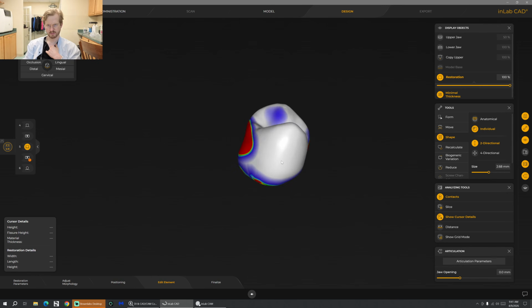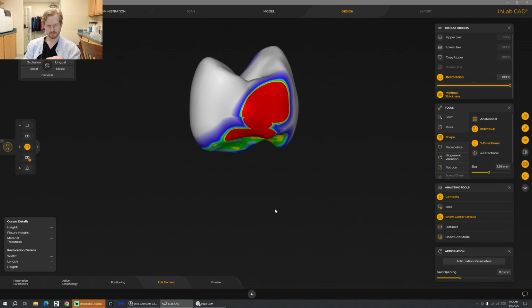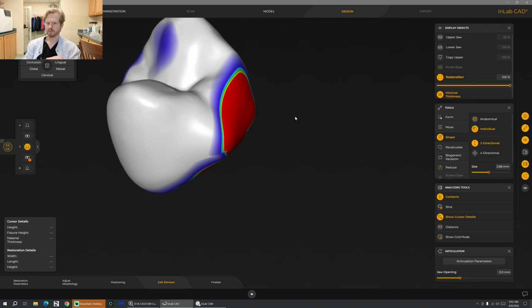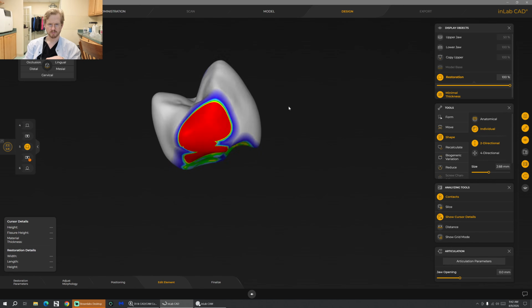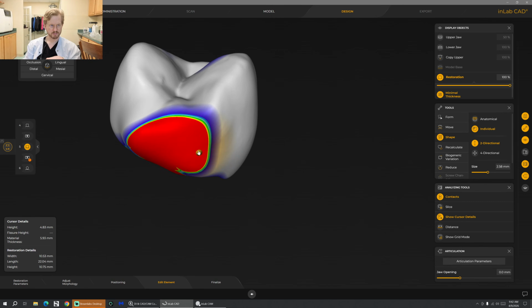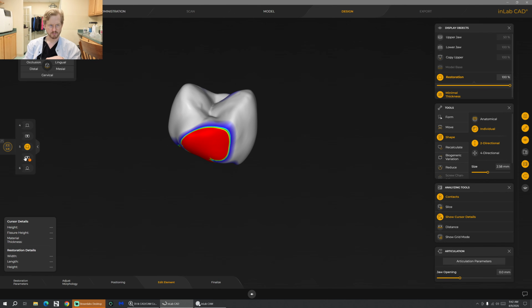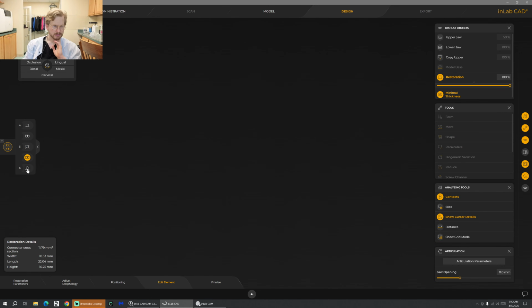Go here to our Pontic. Shape circular out some. See where we're at. 11's definitely enough.